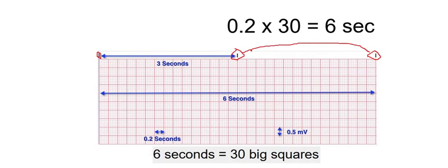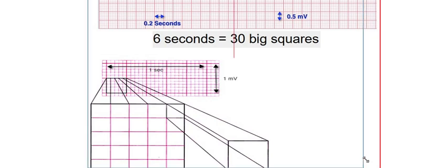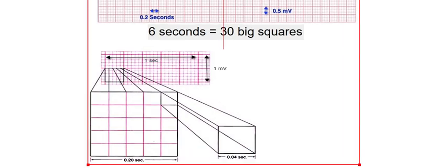All right. So I hope this is clear. You look at this. You need to know this. This is a basic EKG when you read it. Now look at the bottom part here. Actually, this is an extrapolation of the EKG, and so you can see, there we go.